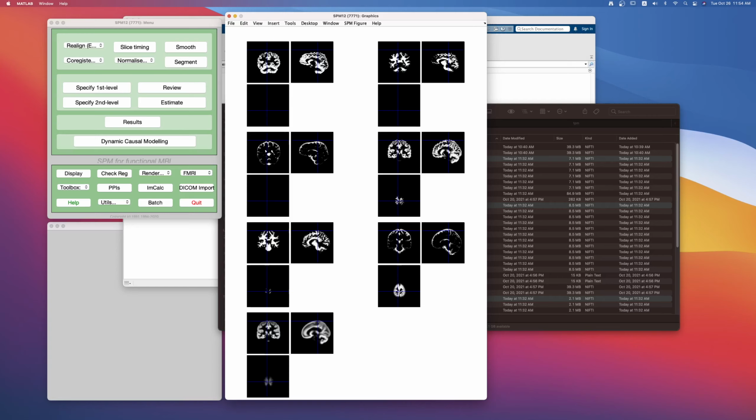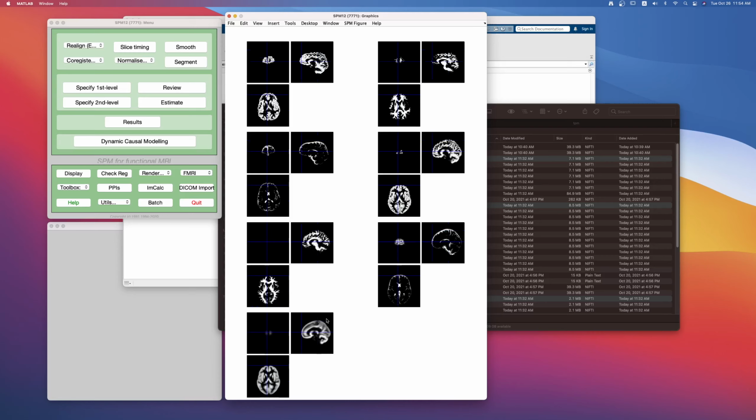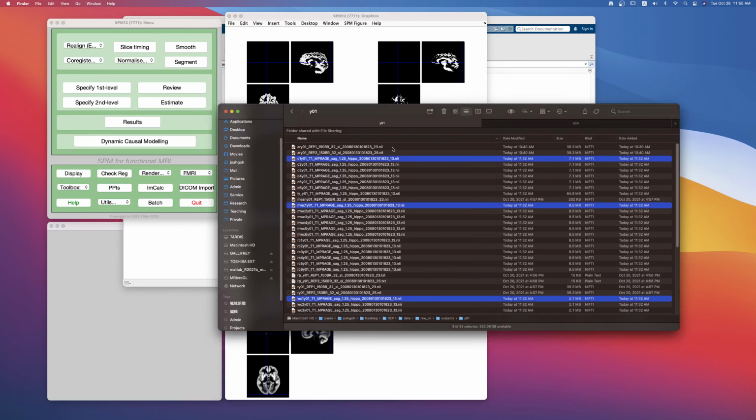The shape has changed. And what it's changed to basically is that now in the W images with the W prefix in front, these are normalized to the MNI space. So if you look here, it will match the MNI template, the TPM template, instead of the subject's original template. So you'll know that basically the W image is the spatial normalization of the original images to the MNI space, and it's done it also for the gray matter, the white matter, and the CSF, and so on and so forth. All right, so yeah, just wanted to go through that so that you guys are clear with the content of the stuff that's been generated from the segment step.